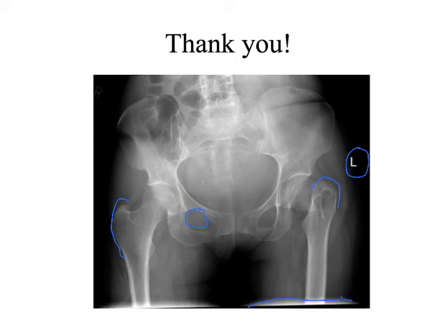So we framed the image appropriately. Probably the reason it's dark is because they used a trauma exposure, right? So I don't think this film needs to be repeated, even if it is a little bit dark, right? Because probably this person's about halfway to surgery already. I would hope. So I just brought this up to show y'all a case of, as we're going through these criteria, it'll also help us make determinations of whether there is pathology apparent on these images as well. So good work, y'all. That was good.